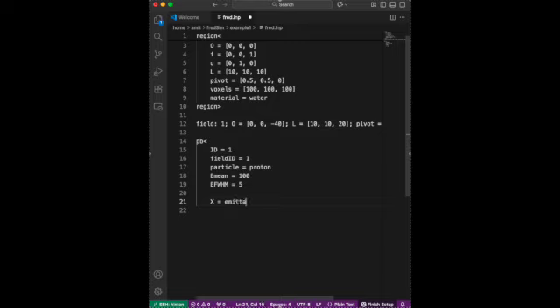Of course, there will be emittance, because when the protons come out of the accelerator, the source, they come out not as a circle but as an ellipse, which, if it diverges in one axis, converges in the other axis.